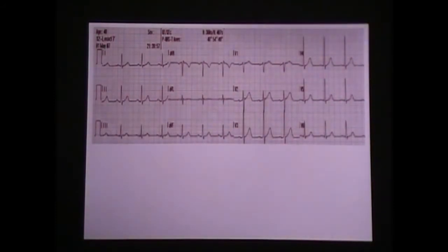Okay. Let me see the button. So first impression, you said otherwise pretty normal. So overall looks pretty good. You said about 85, so it's pretty normal. Okay. PR interval. It's normal. Okay. So QRS, so PR is good. Yeah. P wave morphology. What do you think? Normal. Okay.